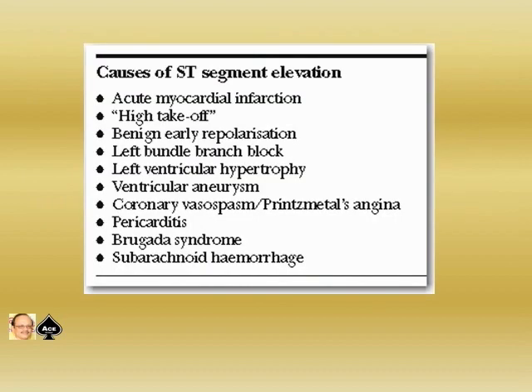So I'm continuing with the analysis of ECG on myocardial infarction. Today something about ST segment elevation and the remaining parts and a few exercises. Now let us see what is this ST segment elevation. Some part was discussed already, and in some of the video sessions which are coming I will go to the basic analysis of the various parts of ECG recording.